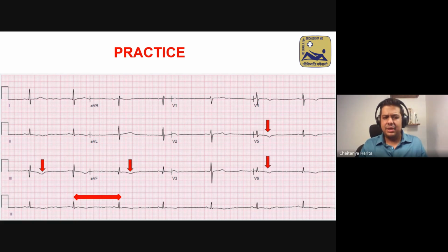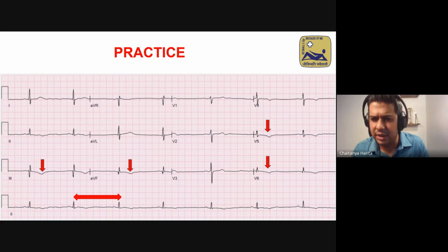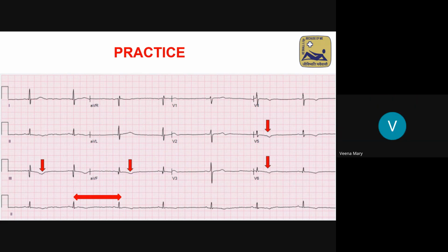Second ECG. I want people to identify this and tell me what the heart rate is. Anybody who wants to volunteer can raise their hand, apart from Dhwani, of course. Anyone? You can unmute and try. Yes, go ahead, Veena. 50, sir.